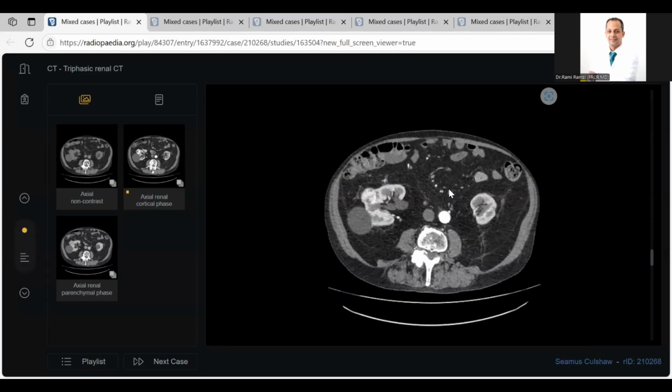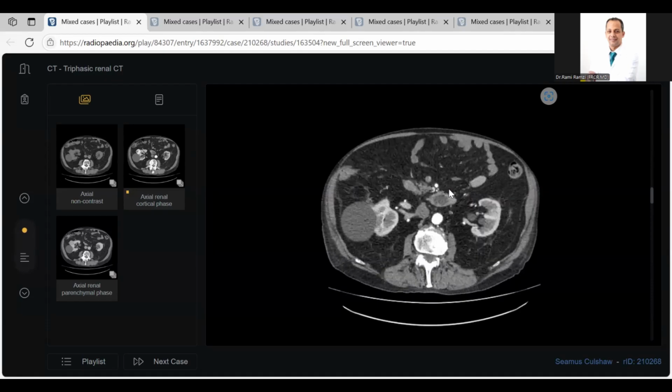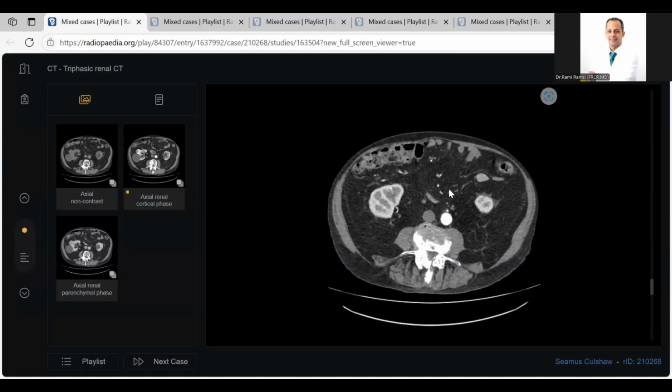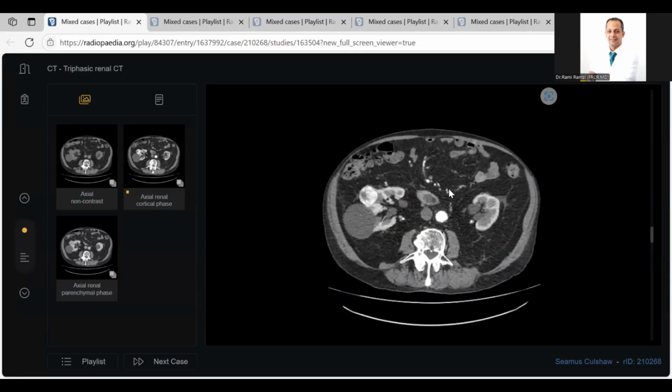Even I was astonished when I faced the first easy case. I was in a big doubt. Is the examiner hiding some disaster behind it? No, this is one of the 60 or 70% of cases that you should face. Very simple, very easy. Hypervascular lesion originates from the kidney with central necrosis, RCC, until proved otherwise. I bring this case because I'm waiting for the candidate to make a fatal mistake.